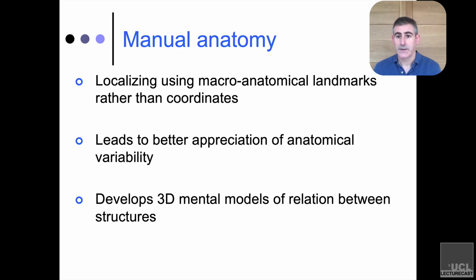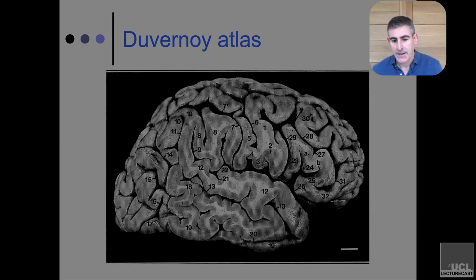all the way around the Sylvian fissure, and it doesn't really tell you where the fornix is and things like that. So it's important to get this kind of 3D understanding of the anatomy, and that's just something that you develop over time. There's no point in rushing it, but there's no point in not doing it either. You might as well work on it, use those tools to help develop those skills.